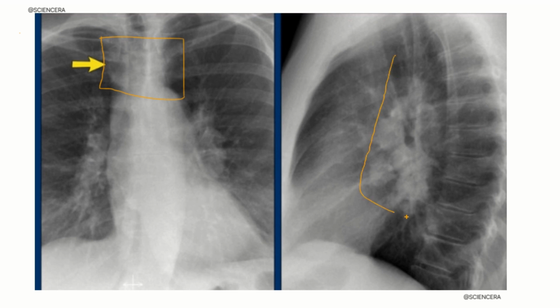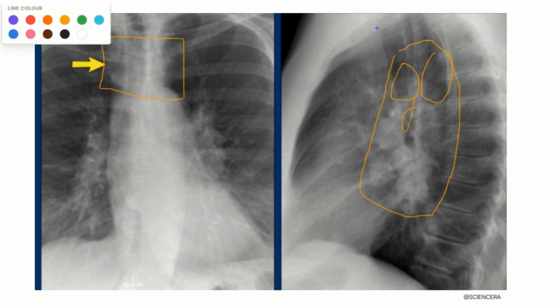So you can see this part here where you don't expect any vessels. There is a round structure in the black, and we can conclude that they are dealing with enlarged lymph nodes, and we can say that the patient has the disease called sarcoidosis. Also notice the widening of the paratracheal line. This is due to the enlarged lymph nodes.